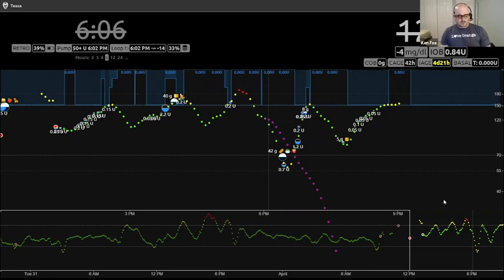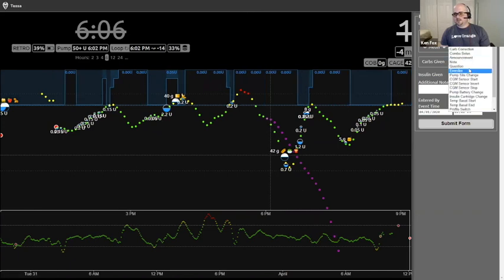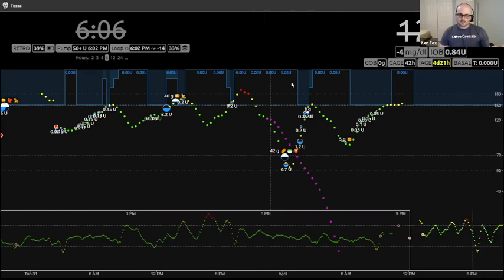Okay, so you can log things like exercise. So let's do exercise. She was outside playing with her siblings for about an hour. Yeah, let's call it an hour, 75 minutes or something. So she did this for 75 minutes, and I'll just say playing outside. And we'll start it at 5:41 today and submit. It'll ask me, am I sure? I say yes, always ask that.